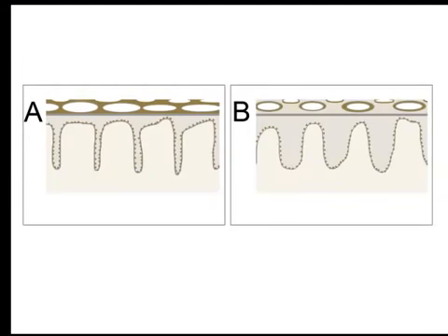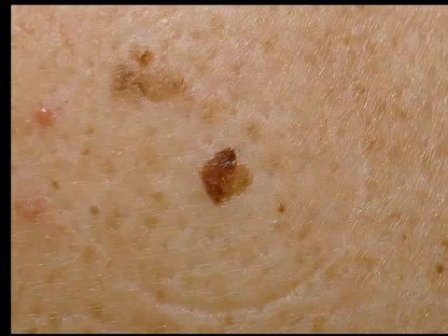Again, the junctional nevus, and you can see, if you look very closely, that the reticular pattern consists of circles that touch each other. But the circles are not separate because the ridges are so narrow. Here you see the dermatofibroma, and you see that there are solitary circles not touching each other. Why? Because the ridges are broad, like in acanthosis in a dermatofibroma. Here again the sketches: A, reticular pattern, B, circles.